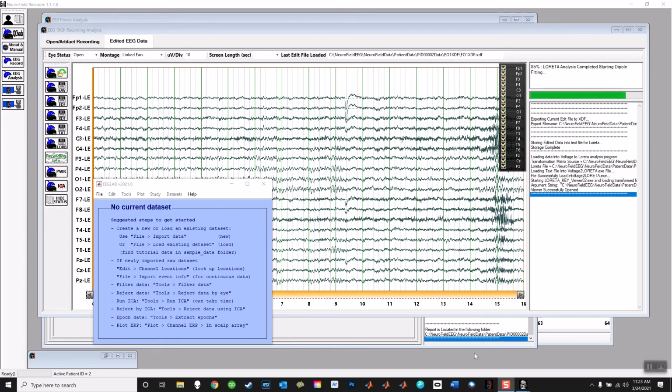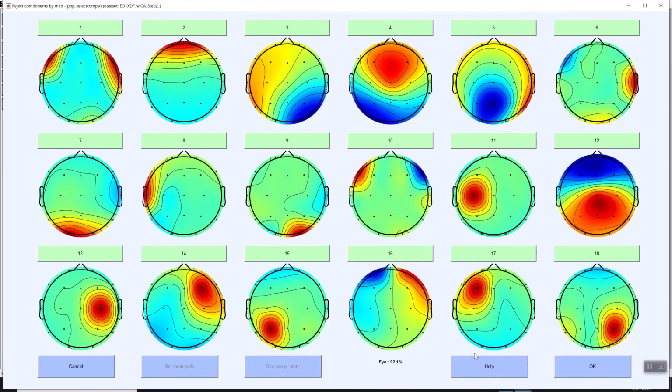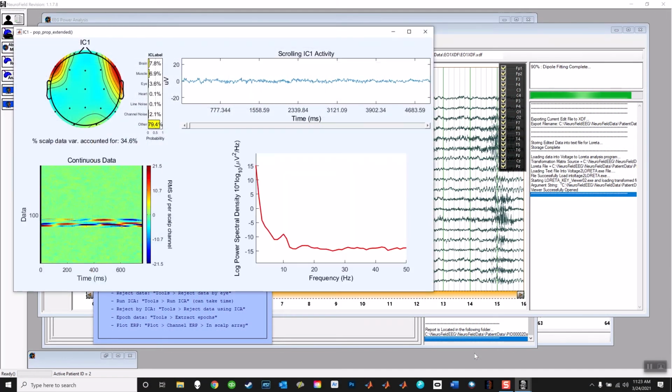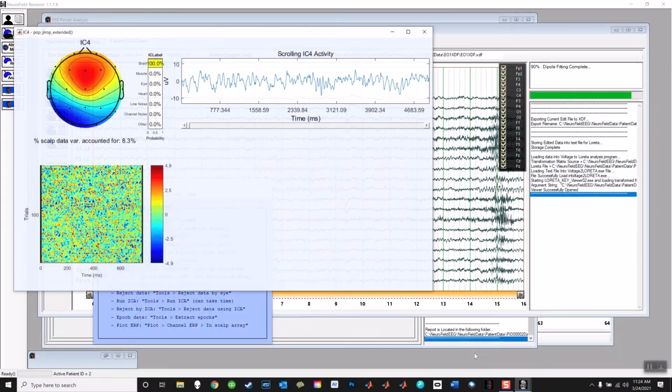And then we're going to run it through another plugin in EEGLAB called ICLabel, which is a categorization program that allows you to take the components that are generated from the AMICA analysis and compare them to databases that have different artifacts like eye movement, brain, muscle, heart. It's a great program. The references for AMICA, EEGLAB, ICLabel are all in the manual.